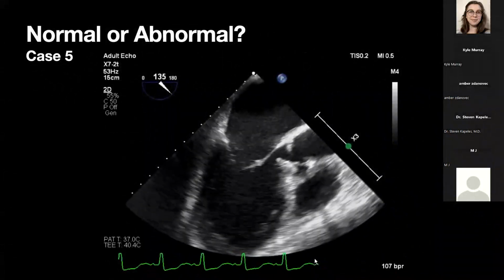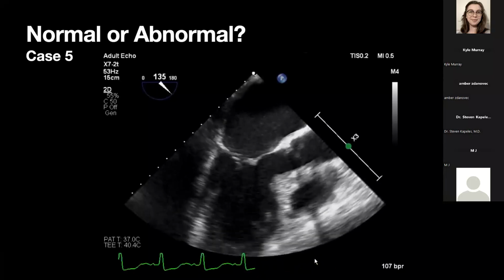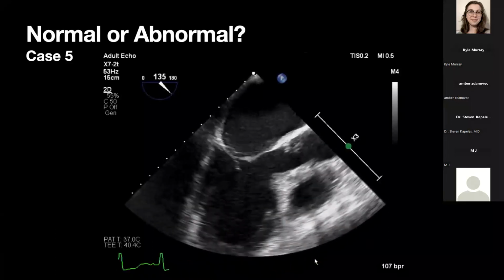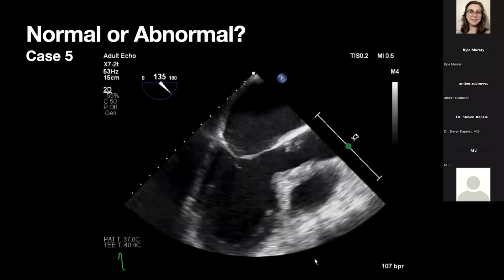It is mitral with the Coanda effect. I think maybe at one point they thought if it traversed the whole anterior leaflet, then it was severe, but I think that's been debunked. Yeah. Okay. Gotta memorize stuff that isn't real.